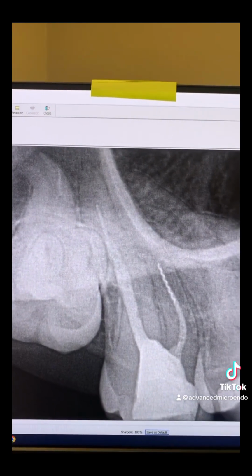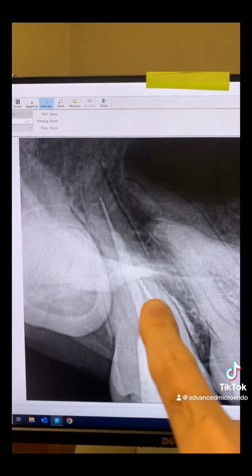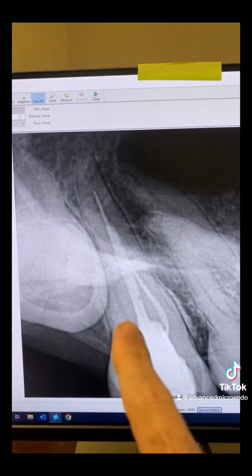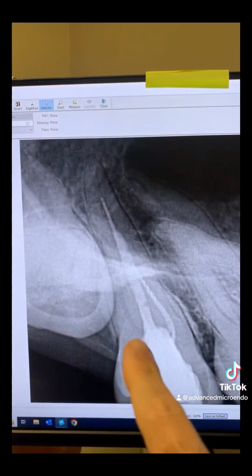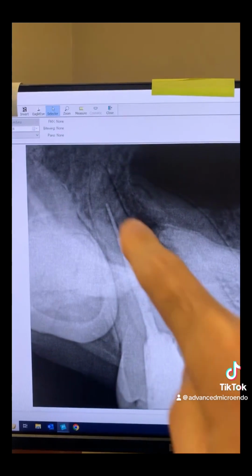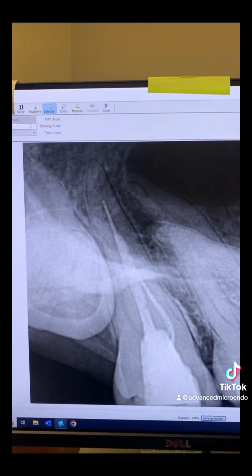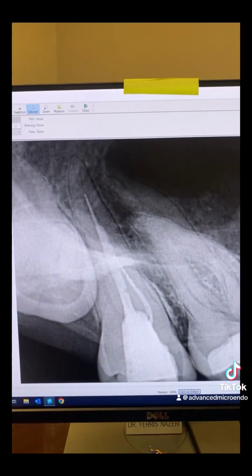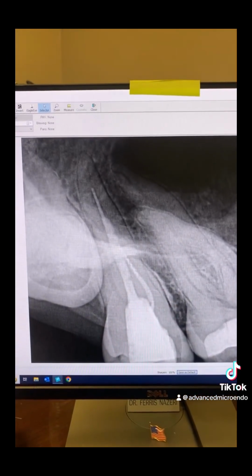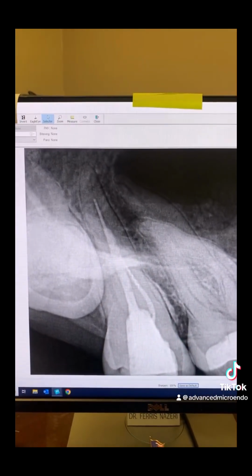All right. Let's look at a different angulation. Again, you can see the broken lentulo here, and it looks like it's actually out of the canal. Look, the DB canal was missed completely. Look at the palatal canal there, and look how short the fill is. Again, no periapical lucency here, here, or here. Patient has no symptoms whatsoever. Tooth was within normal limits, responded within normal limits to percussion and palpation. Probings were 2 to 3 millimeters all around.